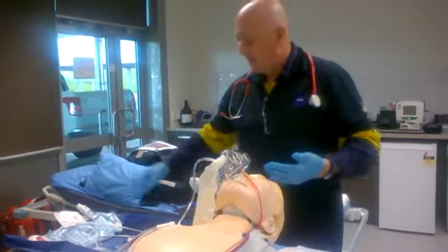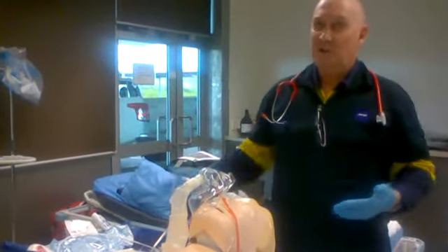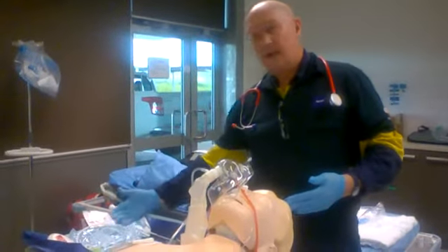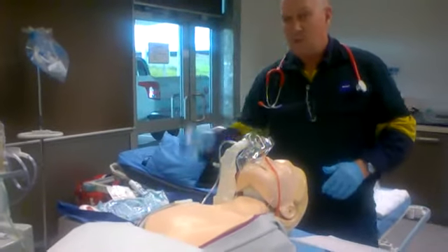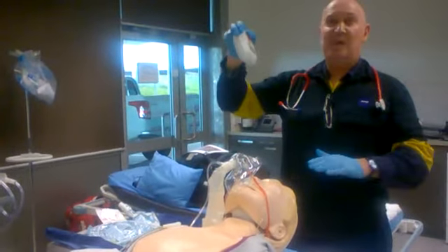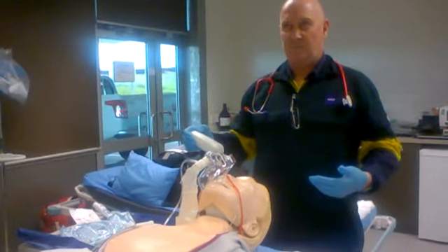So we then go for our blades and our laryngoscope. We have two laryngoscopes in case of the batteries failing, and we have two blades, size 3 or 4. We don't have a Miller here. We only have a Macintosh. We have a surgical airway kit set up on the side. We have a bougie, and we have an LMA. We have an oral airway. We have a naso. And worst case scenario, we have a mask, mouth to mask, if all goes to fail. So this is a lot of planning that we have to do to implement this.